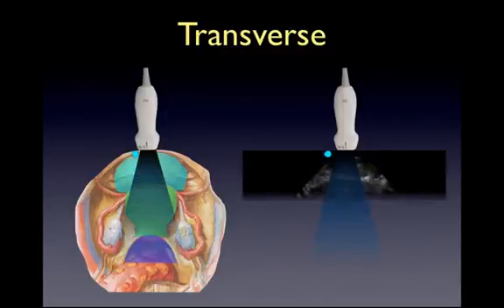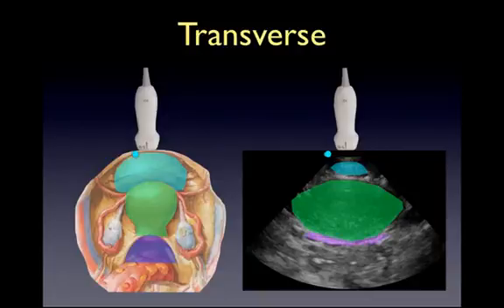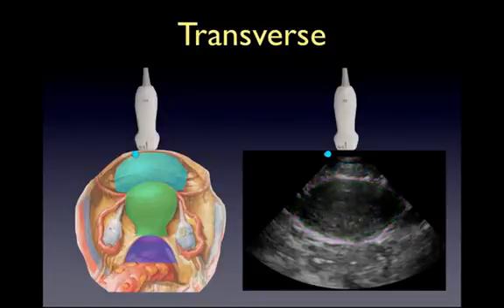In a corresponding ultrasound image, the bladder, uterus, and pouch of Douglas have been highlighted. Adnexa may be found lateral to the uterus on either side, but are usually poorly visualized in the transabdominal view.